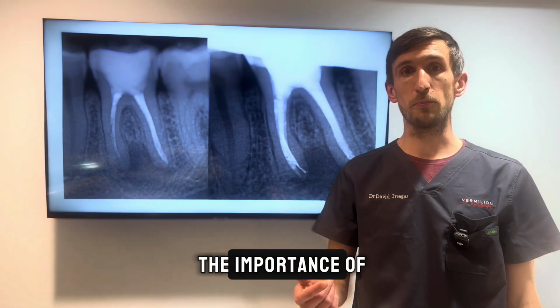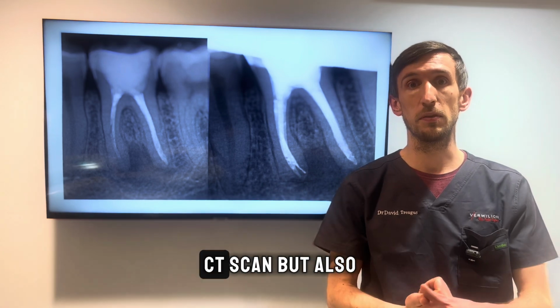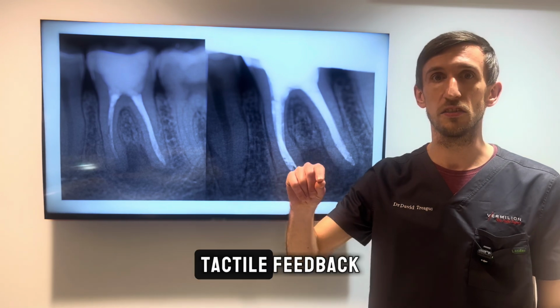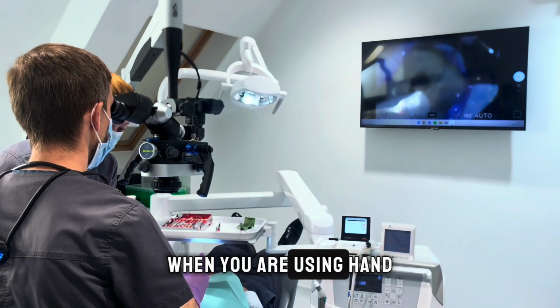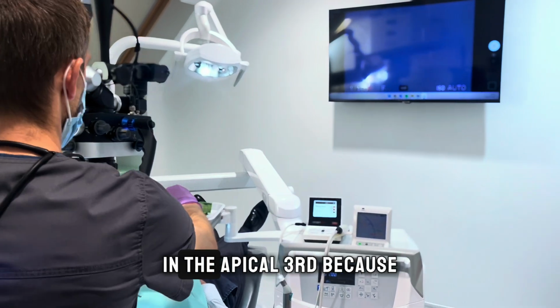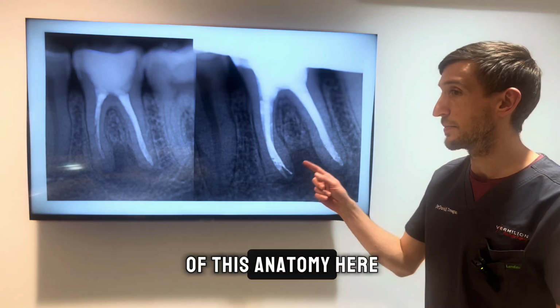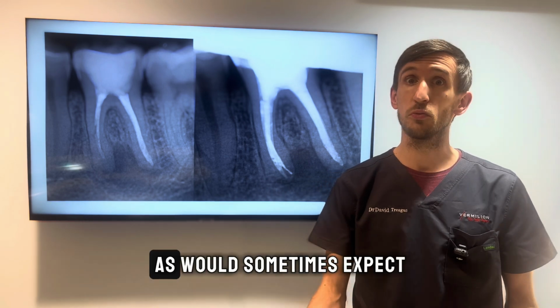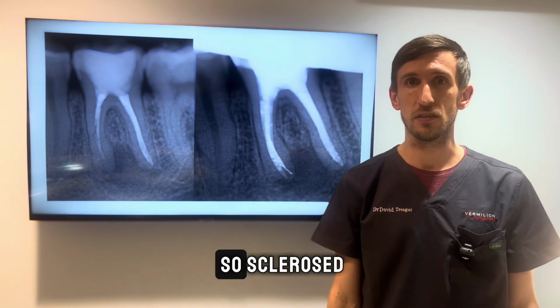So it really shows the importance of not only having a cone beam CT scan, but also really good tactile sensation, tactile feedback when you're using hand files, to make sure that you can feel what's going on in the apical third, because this anatomy wasn't actually as obvious on the cone beam CT scan as we would sometimes expect, because the canals were so sclerosed.